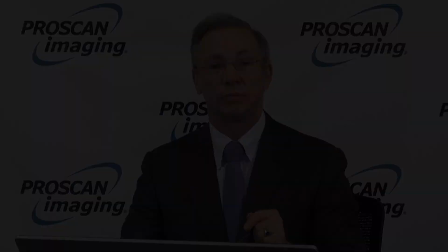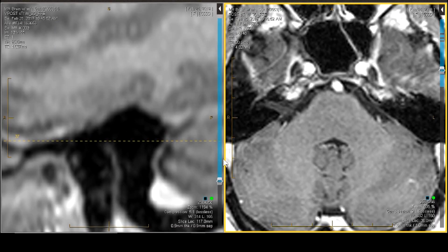So now in the next vignette, let's drive home the individual segments of the seventh nerve. Dr. P here, back with the facial or seventh nerve. We've got a beat on the seventh nerve on our axial high-resolution T1 weighted image and our sagittal orthogonal image. Now, the nerve typically travels from the pons, from a nucleus, which we've defined in prior vignettes, that loops around the abducens and then comes out the side just at or above the bulbopontine sulcus.